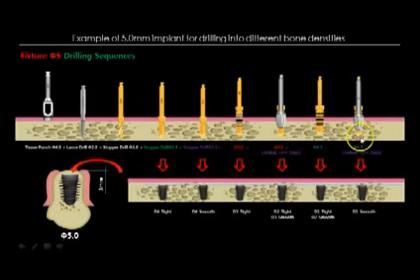Now I purposely left out a drill here. This is 4.3 in your cortical bone. Remember in your kits, we talked about all your stopper drills that you have. You actually have a 4.8 drill. Now your 4.8 by 7 millimeter stopper drill can be used also as a cortical bone drill, because remember, your medium cortical bone drill goes up to 4.4. Now your 5.0 implant up top is actually 5.2. Remember, because of that extra width up top here.